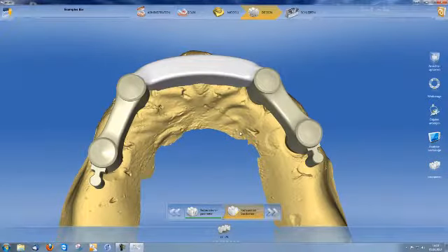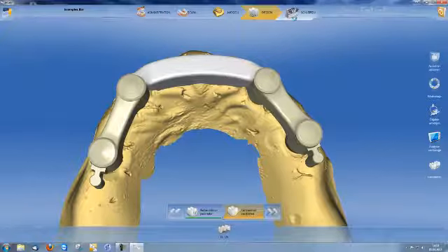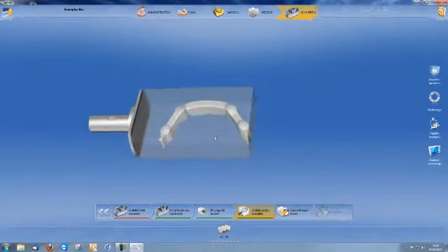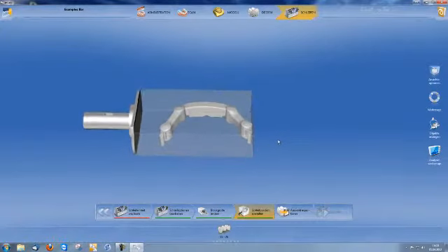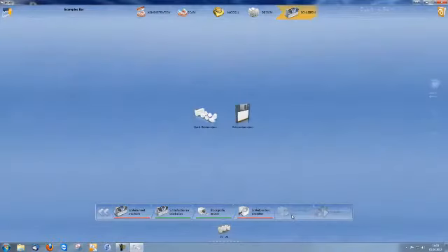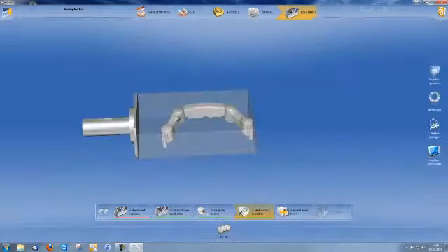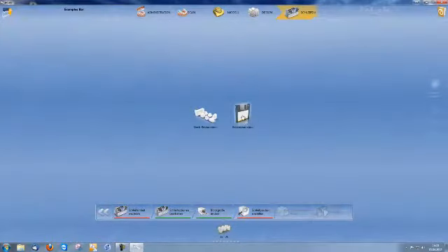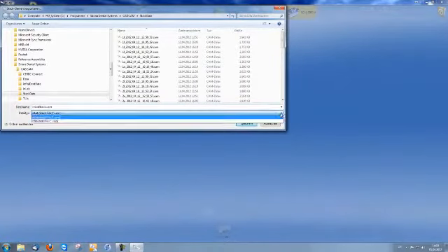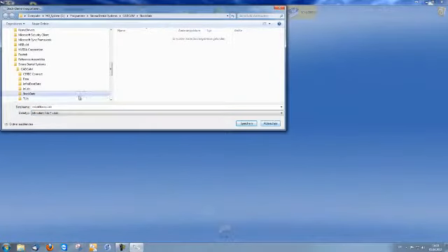Once the design has been concluded, I go to the milling review. The restoration is now displayed in the block. I can save this in the InLab software or export my selection in order to either mill it in the Stack software or to save it as an Infinident file via File Restoration, and to have it manufactured in the various metals.